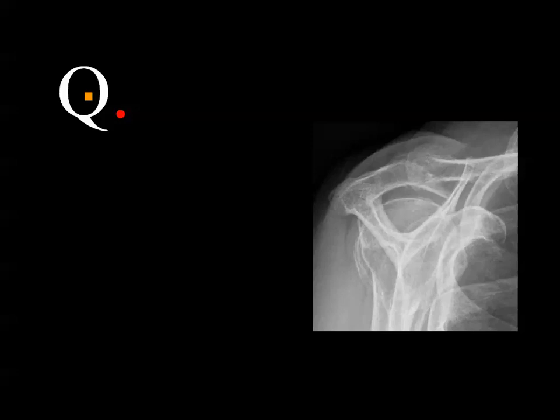Lateral view of the shoulder. This is not to exclude dislocation, but there is no dislocation. مفيش dislocation بس في اللي هو الأكروميوم type 3 with anterior hook.